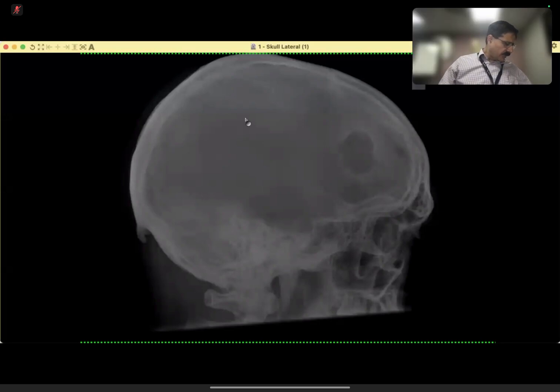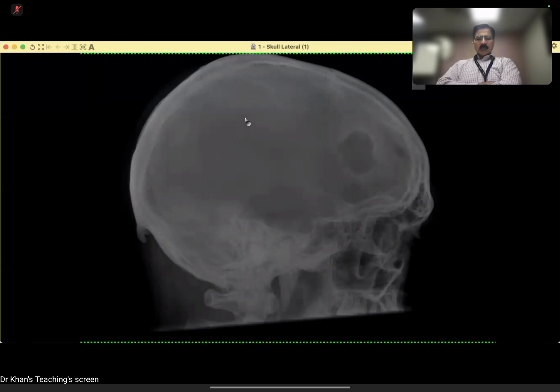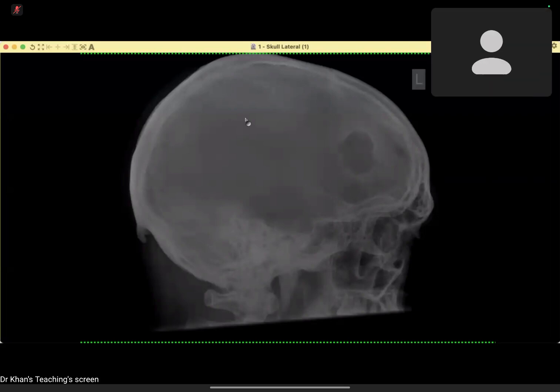This patient is a 38-year-old male. The patient has pituitary hyperfunction, and the X-ray was done to rule out any bony evidence of acromegaly. Over to you. Yes, I have been presented with a lateral skull radiograph of an adult patient, searching for features of acromegaly due to pituitary hyperfunction.